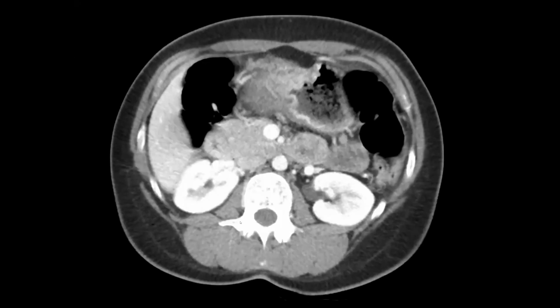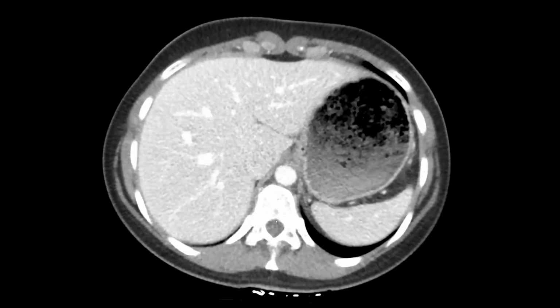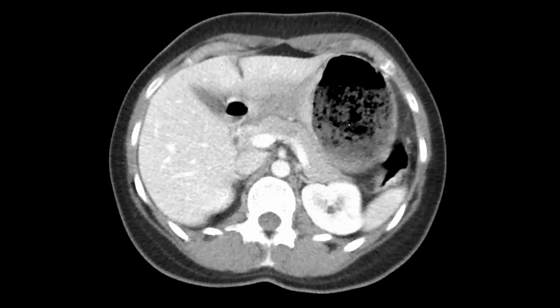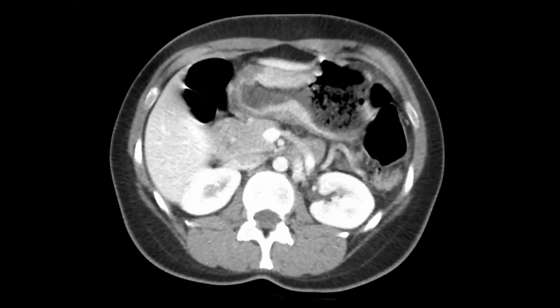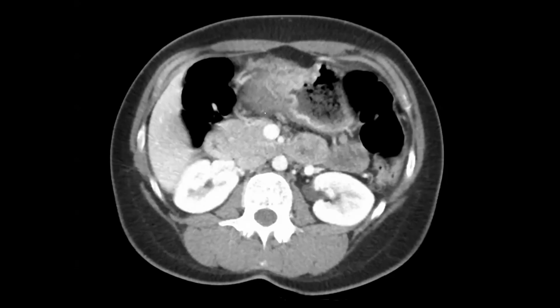What do you think that is? Is it like linitis plastica? Yes, exactly. We've got some upstream debris in the stomach and relative obstruction, but we've got this really densely enhancing thickened wall here. There was a question whether this could just be severe gastritis. With gastritis, maybe you'll see more submucosal edema, but this really densely enhancing wall with luminal narrowing and upstream obstruction is much more concerning for linitis plastica.